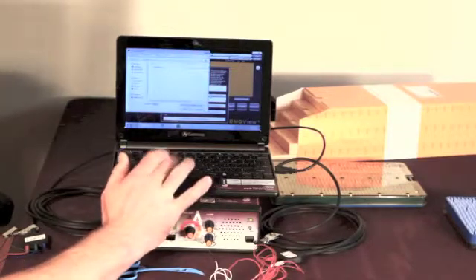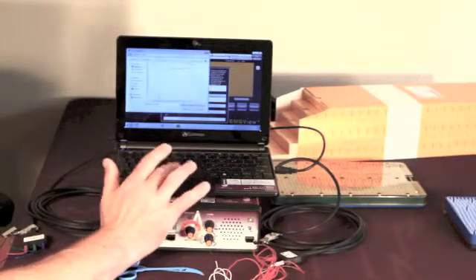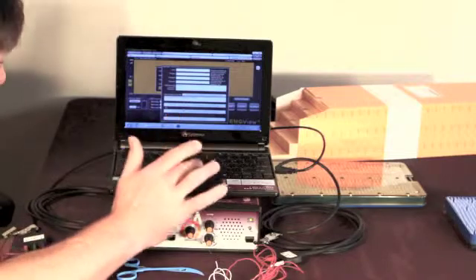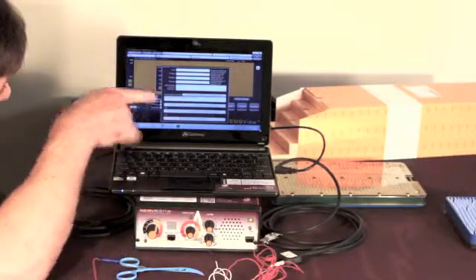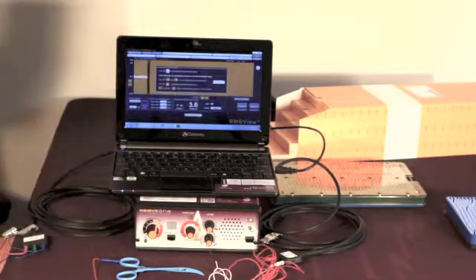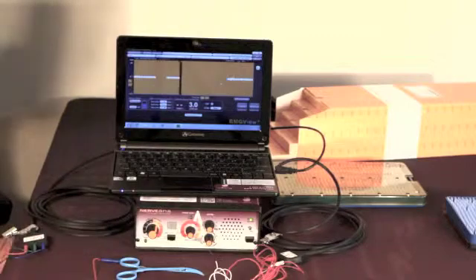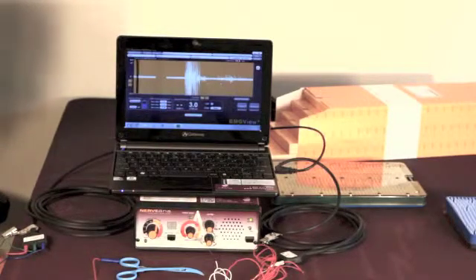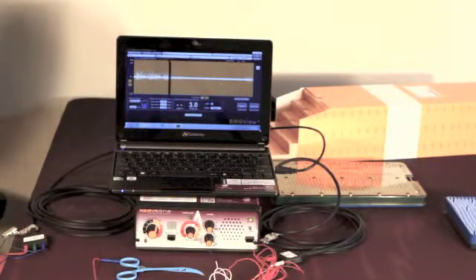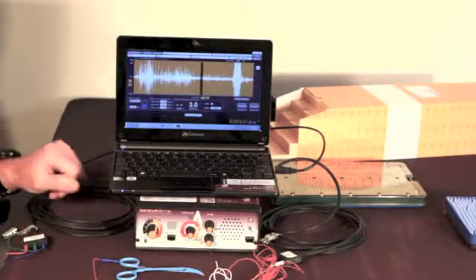So this is your typical Windows Explorer system here, and I have a folder called EMGView that I'm going to choose on my desktop to save my file here that we're going to record. So now I'm going to click the Start Case, Saves Above, and Start Saving Playback Data in the file named above. So here we go. And there's a little window that describes some of the controls when you first start up that you can close. And there we go. You can see down here there's a little green graphic spinning that indicates that you are actively recording the case.